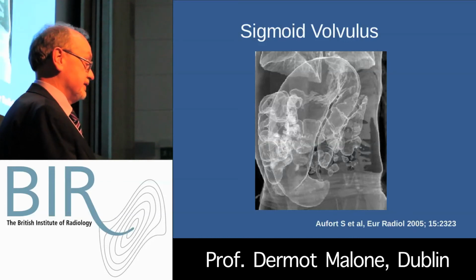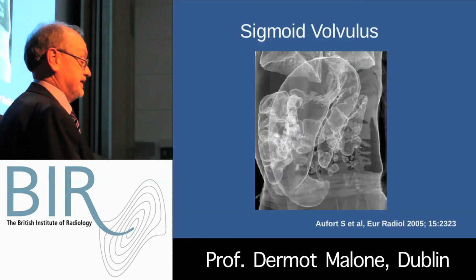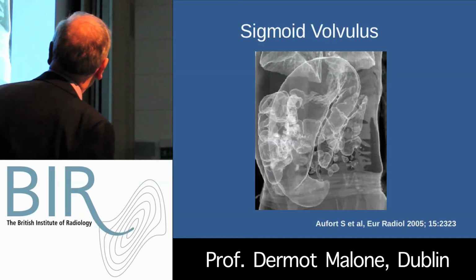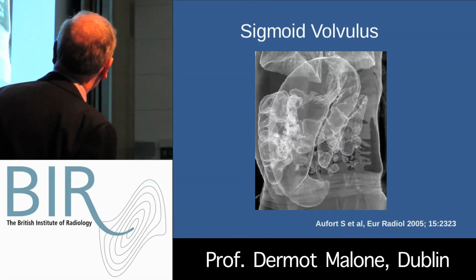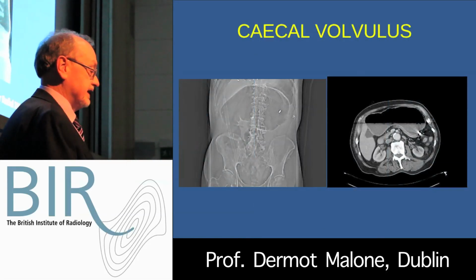And all they did was bring their CT into the 3D colonography type package that a lot of the systems have, and suddenly they've got a nice image of the classical coffee bean loop with the opposed walls, apex in the left lower quadrant, upper end below the diaphragm, and overlapping relatively non-distended colon, typical for a sigmoid volvulus.